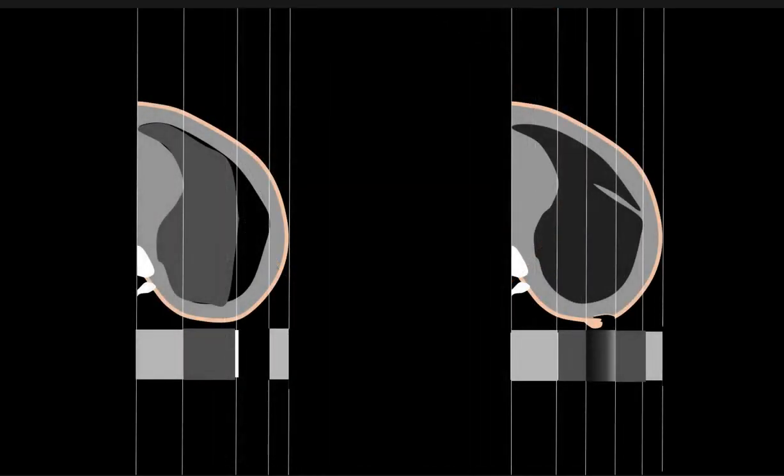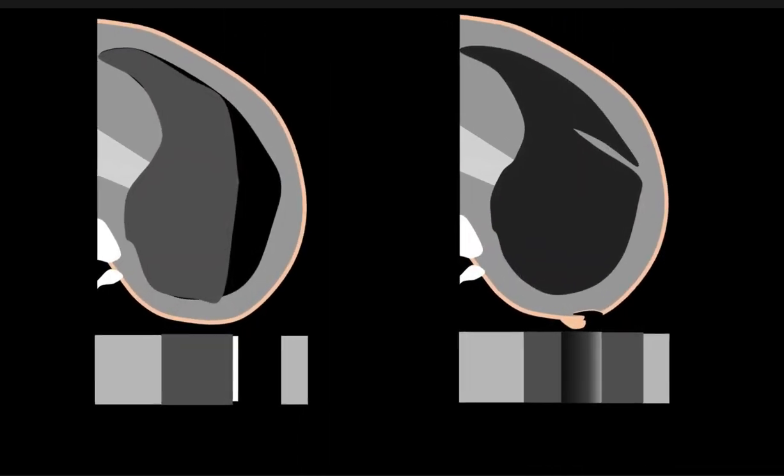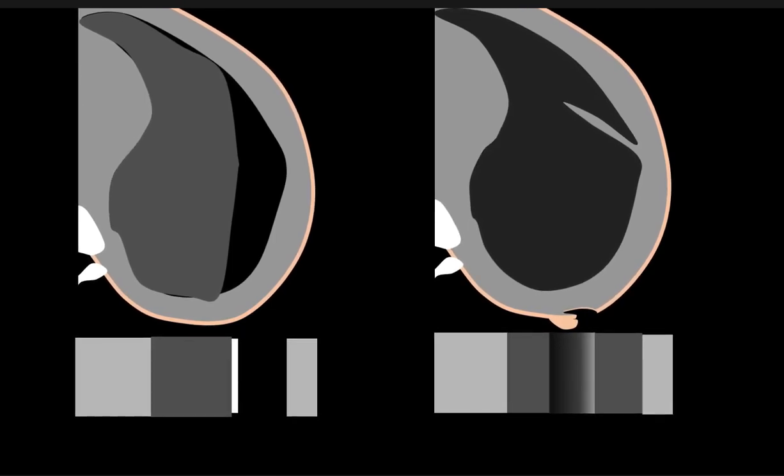A folded bed sheet or blanket could cause a similar appearance, like a lump that has a gradient then on the other side. And then it's going to return back to the air that's within the lung, so it's going to look the same as it was before the skin fold, and then chest wall density, and then air at the end. All right, so we'll look at these things side by side, bring them in closer together, maybe stack them like this.